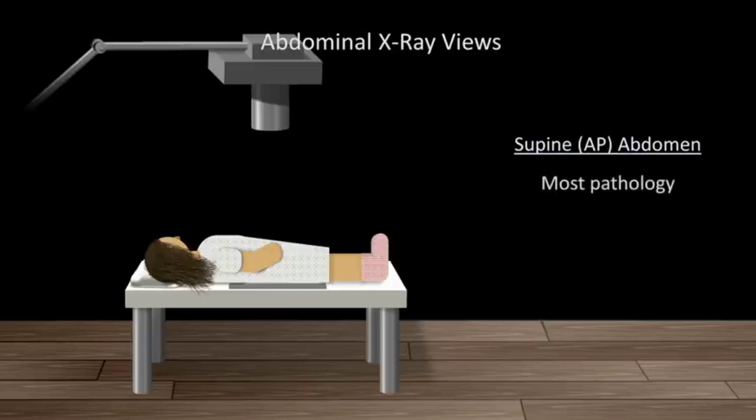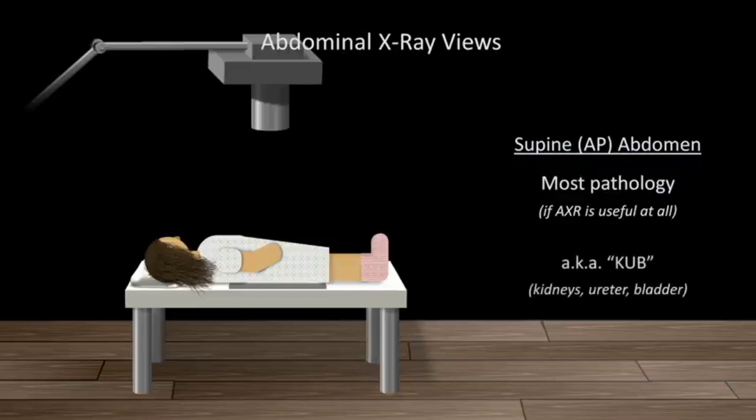This is an example of an abdominal x-ray. So you can see we have the lung up here, which shows up as dark. Inside the bowel loops, we have gas, which shows up as dark. On the other side of the scale, we have dense things like bone that show up as very white. In between the two extremes, we have soft tissues.